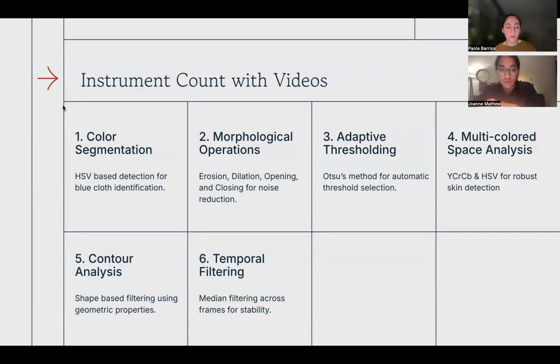And we applied some erosion to shrink the ROI inwards, avoiding any edge artifacts. We made sure that this was also a dynamic ROI. The reason being that as you're taking the video, it tends to move. So every 5 frames, we would make sure that the ROI got updated, which helped to adapt to movement in that surgical cloth.